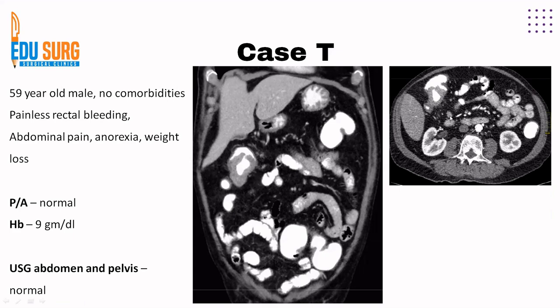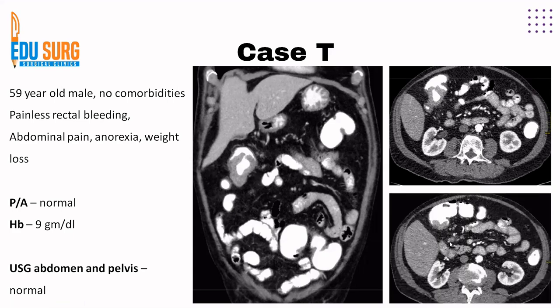And here you can see there is a lymph node, another image where there is a lymph node in relevance to this tumor. This lymph node can change the staging. In colon cancer, as we have already discussed, the staging for node positive disease is at least stage 3, right? So from stage 2, it immediately becomes stage 3. This is how knowing your scan findings matters. So this is a lymph node. You can see some nodes in this area. So again, a case where seeing the scans on console, you can start identifying these structures better.